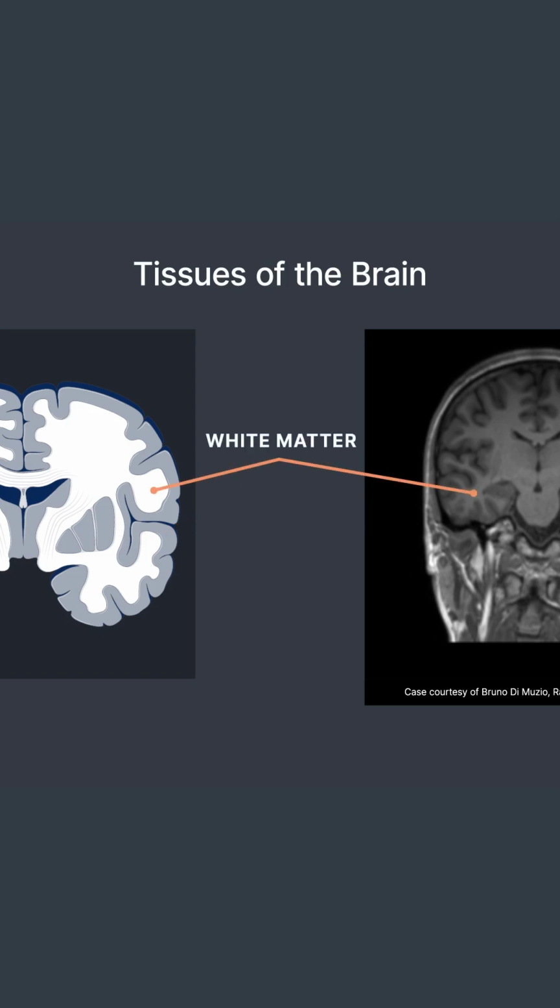The white matter is located more on the interior of the brain and is easily identified by its branching appearance. Most of the tissue is myelinated, meaning covered with a fatty substance. This tissue serves to send signals from the cortex to other parts of the brain.